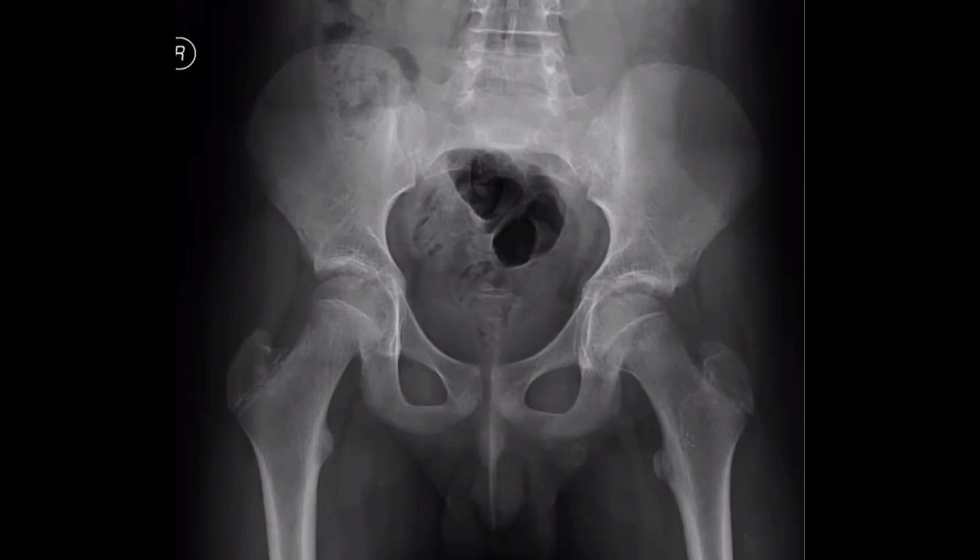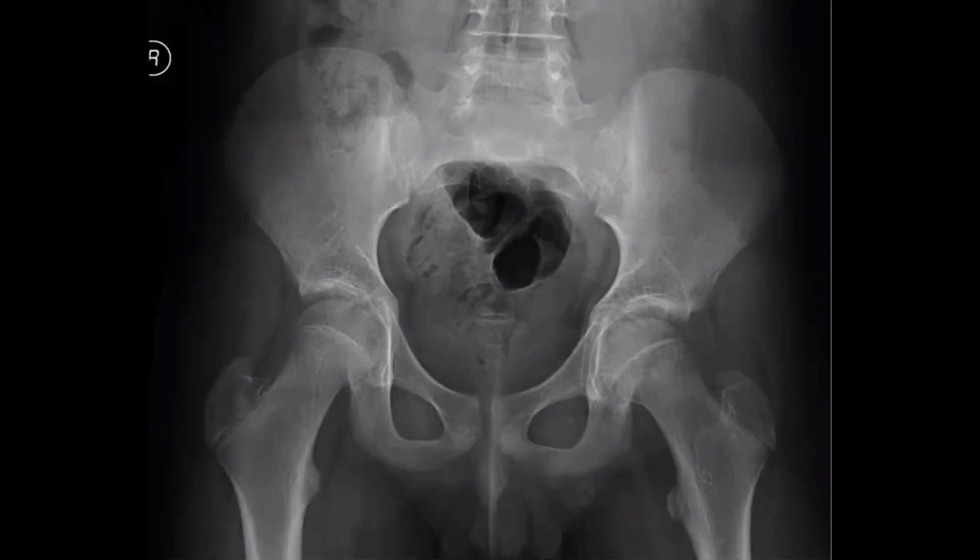Apart from that, my concern is the irregular cortical outline of the femur. I would like to refer this patient for ultrasound to see if there is any underlying effusion or synovitis, and then confirm my finding to the referring physician. The iliopsoas fat planes here are similar to here, so I think we don't have any joint effusion. In this age group, with left hip pain, can you focus on the head and neck itself? Can you focus on the physis? Can you compare the physis on the left side with the right side? Yes, sir.